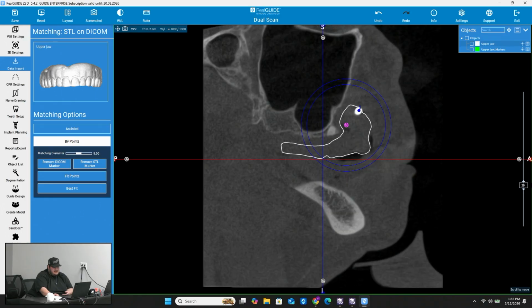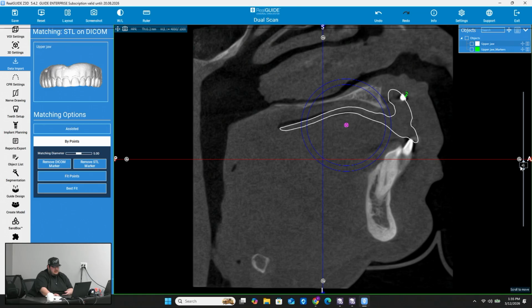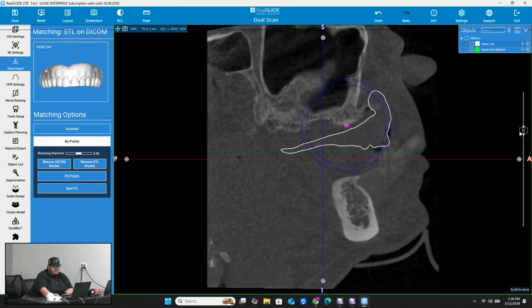One of the main ways is that when you get to a marker, make sure you can see that those markers are aligned with not only the outline, but the one on the actual CT scan itself. Of course, because this is a prosthesis, none of the white line should be impinging on the bone at all. There should be space there, but you can almost see an outline of this patient's appliance.